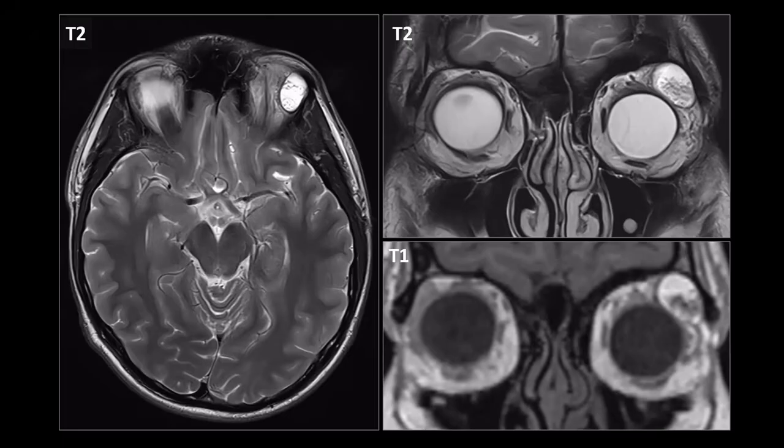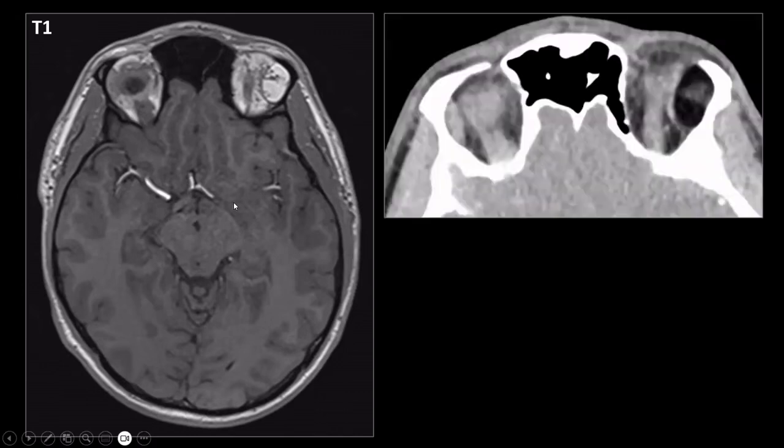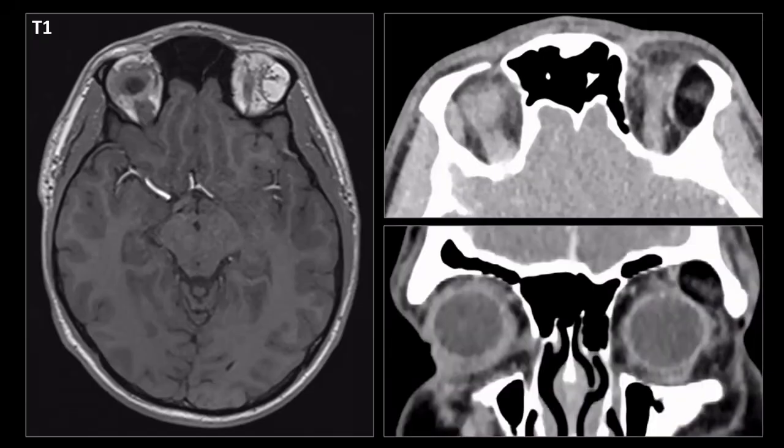Now, what is hyperintense on T1 weighted images? Could be fat, could be blood. How to make the distinction? You could do fat-saturated MRI sequences. This was not done in this patient, but we did a CT, and the CT images will follow later, I believe. These are the T1 weighted images showing you the T1 hyperintense lesion. Oh, and here is the CT, and the lesion is very, very hypodense, and the density was somewhere around minus 70 Hounsfield units, so this was fatty tissue. Also notice the hypodense aspect of the lesion on these coronal images.